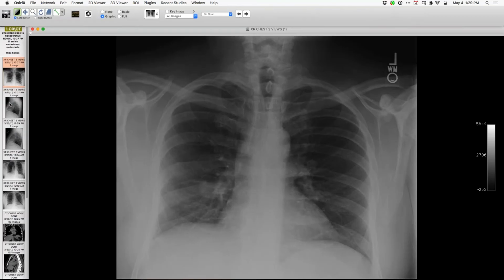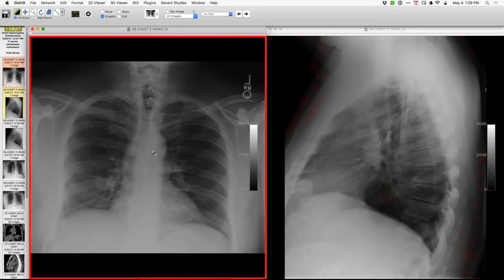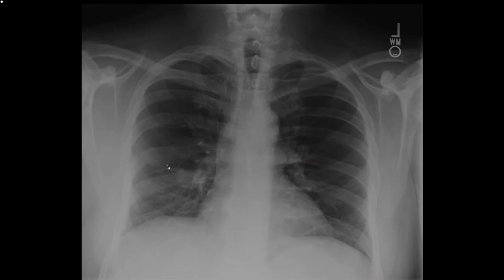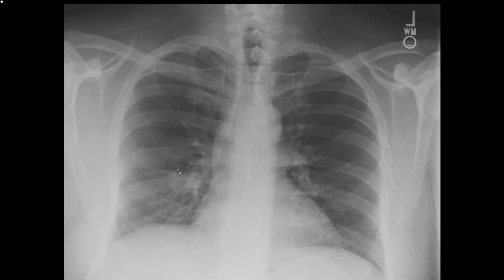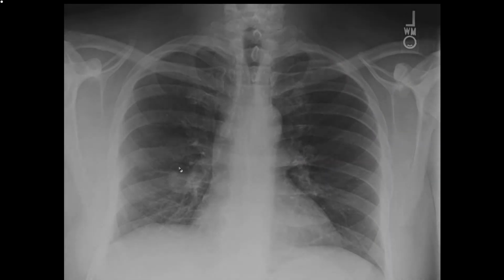This one is interesting from 2 points of view. One is the perceptual challenge. So let me bring this up. I've shown many cases like this before, but we're always humbled. So here's a chest radiograph in an outpatient, and I'll give you a moment to look at it just as you would see it on your workstation, something like that for the frontal projection of the chest.